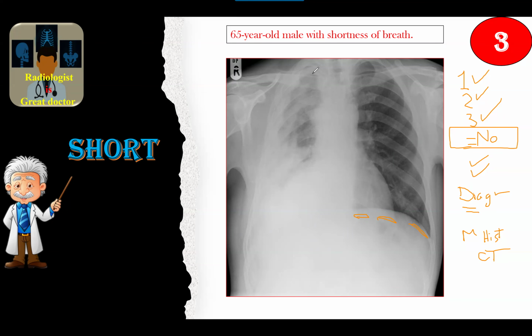Diagnosis: right pleural thickening, most likely neoplastic etiology like mesothelioma. Accepted. For correlation with history, occupational history, and urgent CT, plus or minus biopsy. We will indicate also biopsy, histopathological correlation and biopsy.